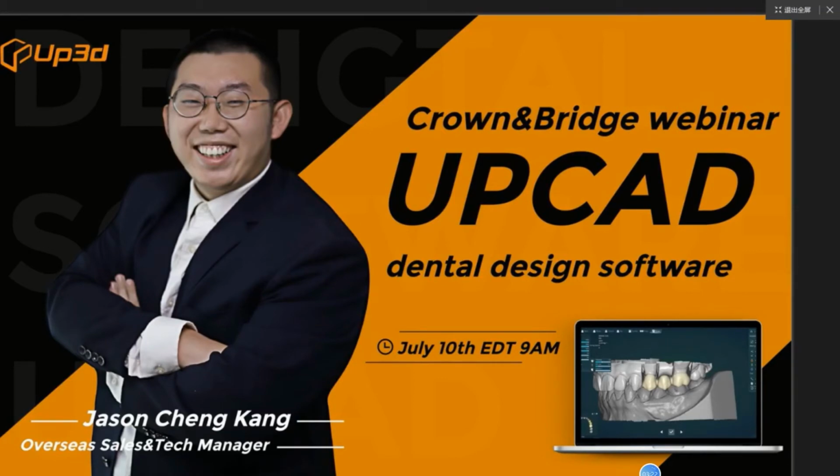And today we're going to do this webinar about our self-developed UPCAD software, crown&bridge designing.